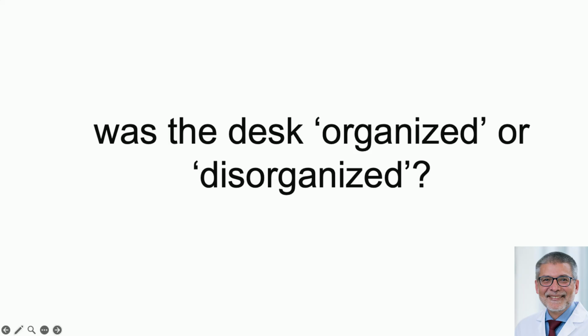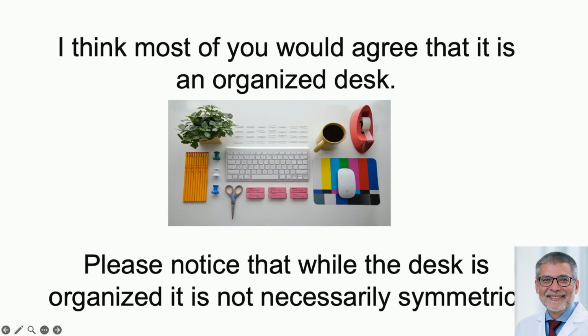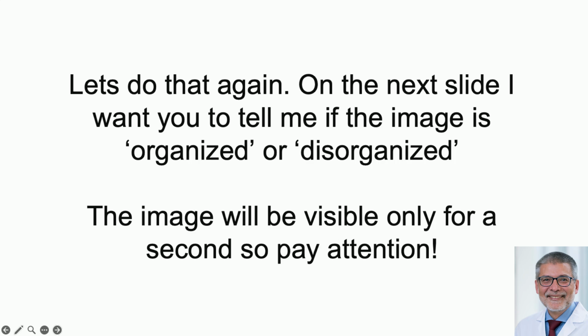Organized. But you already know it's not symmetric. Pencils on one side, it's not symmetric. But your brain instantly knows that everything is where it's supposed to be, yeah? All right, so that's that concept of organized, not necessarily symmetric. Now, let's take a look at another one, okay? Here we go.